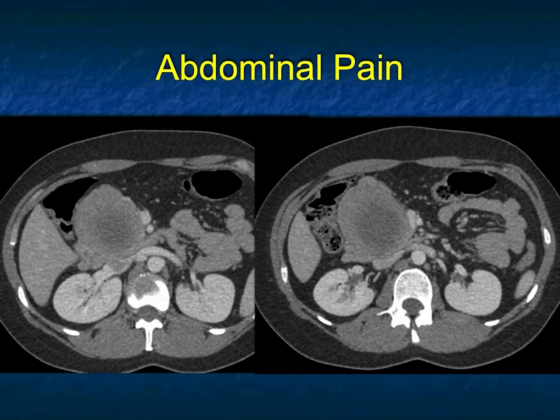This patient has abdominal pain and a large mass in the head of the pancreas. In the little bit of liver you see, you do not see dilated ducts. So you have a large mass. The first question is, is this really pancreas, or could this be duodenum? That's a thought, and of course with just a couple images it can be difficult. But for argument's sake, I would pick pancreas here. Could it be an adenocarcinoma? That's a possibility, though it is pretty large. And if it was that large, I would have expected to see some duct dilatation.